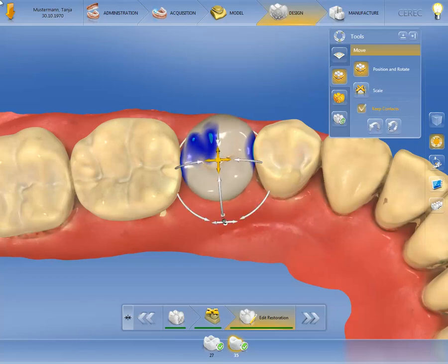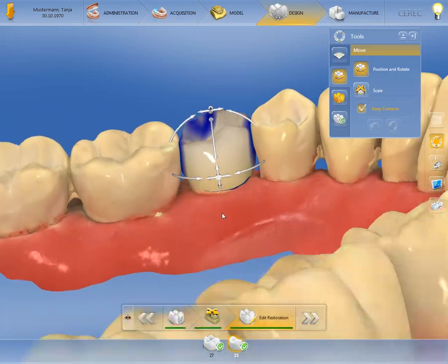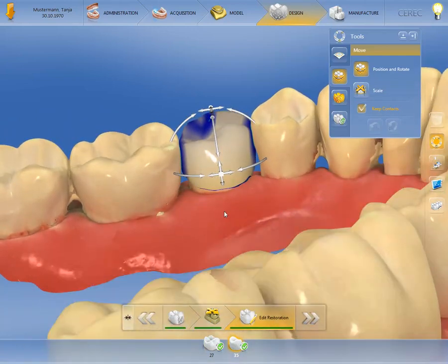The cursor can also be positioned in the center of the cross. This allows continuous and stepless movements towards both axes. Select Undo to discard the changes. Additional direction arrows and arrow axes appear once you align the perspective to lingual direction.